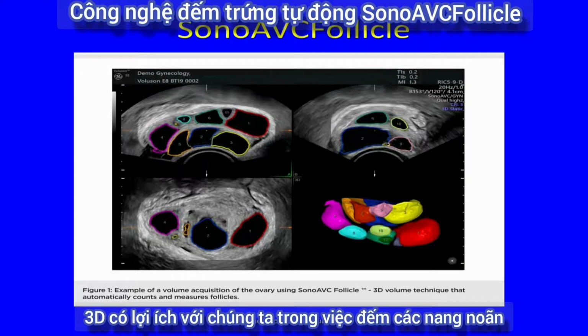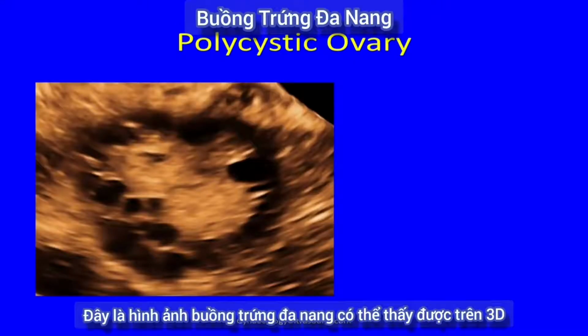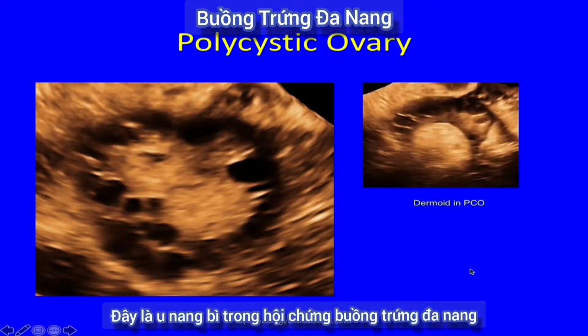3D is useful for follicle counting. You can measure them and count them using this SonoAVC technology. And this is what a polycystic ovary would look like on 3D ultrasound, where you can now see more than 20 little follicles, giving you a diagnosis of polycystic ovary. And this is a dermoid in an ovary that is polycystic.